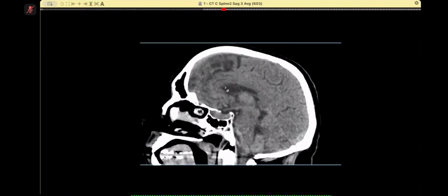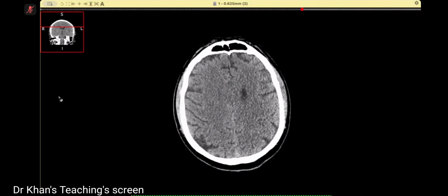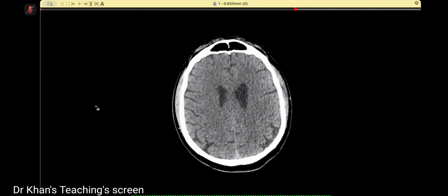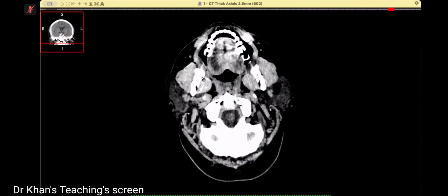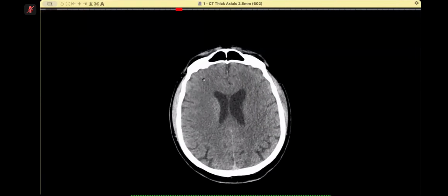So what happened is that this is a patient, let me show you, 61-year-old. Okay, sir. 61-year-old fall. The patient had a few drinks and had a fall in the lounge, banged head on a table. So A&E scan. Over to you.